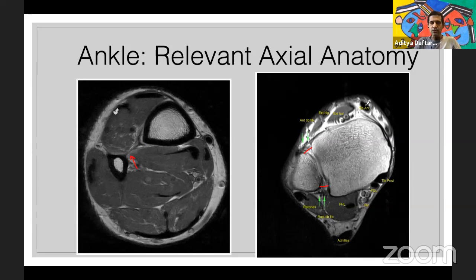Anteriorly, the tendons, you will find the tibialis anterior, the extensor hallucis, the extensor digitorum. And therefore I tend to remember the anterior ones are anatomic. So anterior anatomic, that sort of sounds similar, so I can go with that. Whereas the posterior ones, you have the posterior tib fib over here, the tibialis posterior tendon here. Then you have the flexor digitorum longus, and then finally you have the flexor hallucis longus back here. So these are not so much in the anatomic way, because they cross at the knot of Henry lower down.